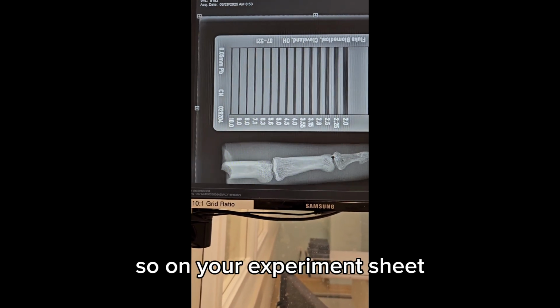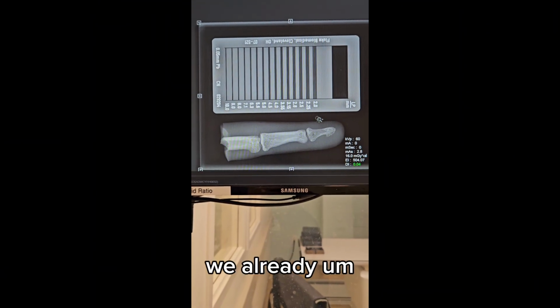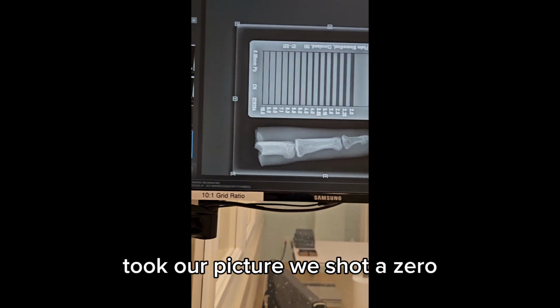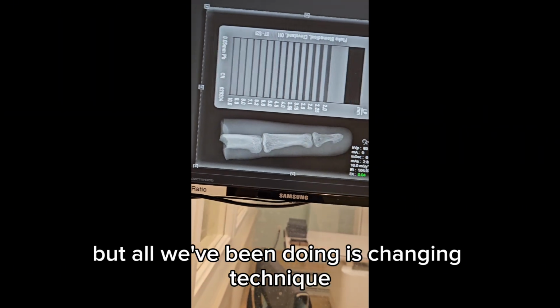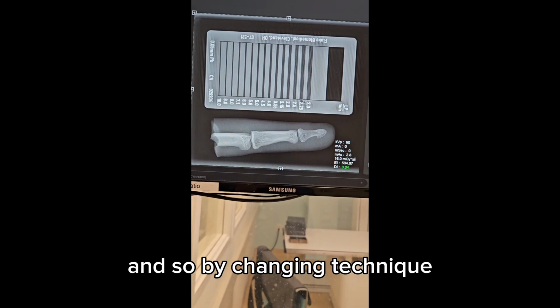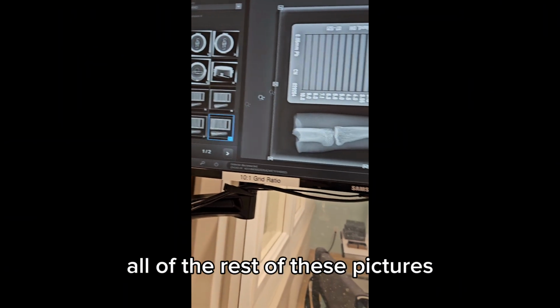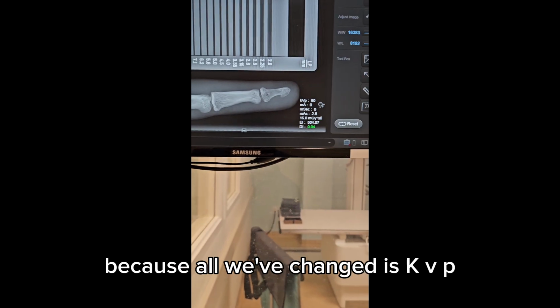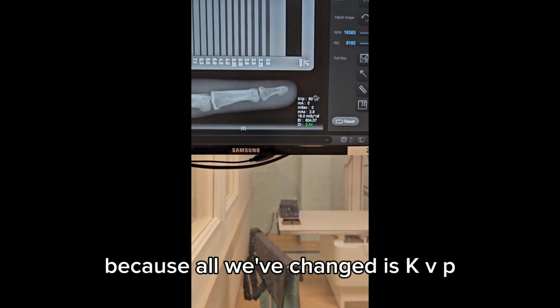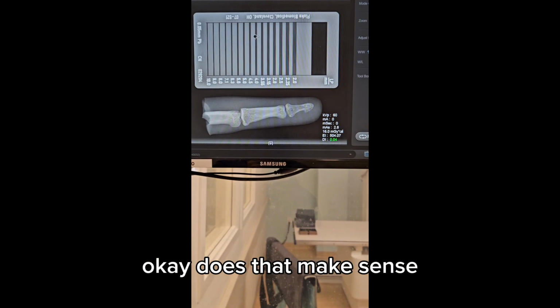So on your experiment sheet, we already took our picture, we shot a 0, but all we've been doing is changing technique. And so by changing technique, all of the rest of these pictures that we have taken will still have a spatial resolution of 4.0 because all we've changed is KVP, and KVP does not affect spatial resolution. Okay, does that make sense?